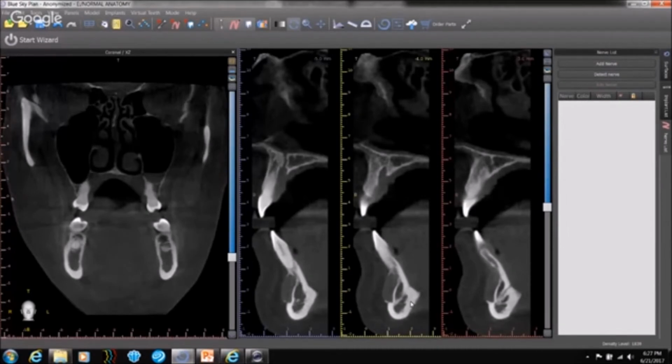Most patients who have any of these would be on some sort of drugs, which would indicate that there are other systemic issues. Now, since we are in that area, another critical structure that I spoke of in the maxilla, the incisive canal right here, you can clearly see it's patent. It goes into the floor of the sinus right over there.